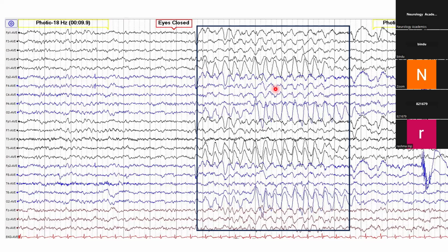Once upon a time it was thought that children showing this activity, it's like a signature of absence epilepsy, but that has not been proved. That is how the phi rhythm got into the picture, but it is nothing but OIRDA seen only during eye closure. So these are all fancy questions for examiners, but otherwise it is nothing but OIRDA, seen only during eye closure.